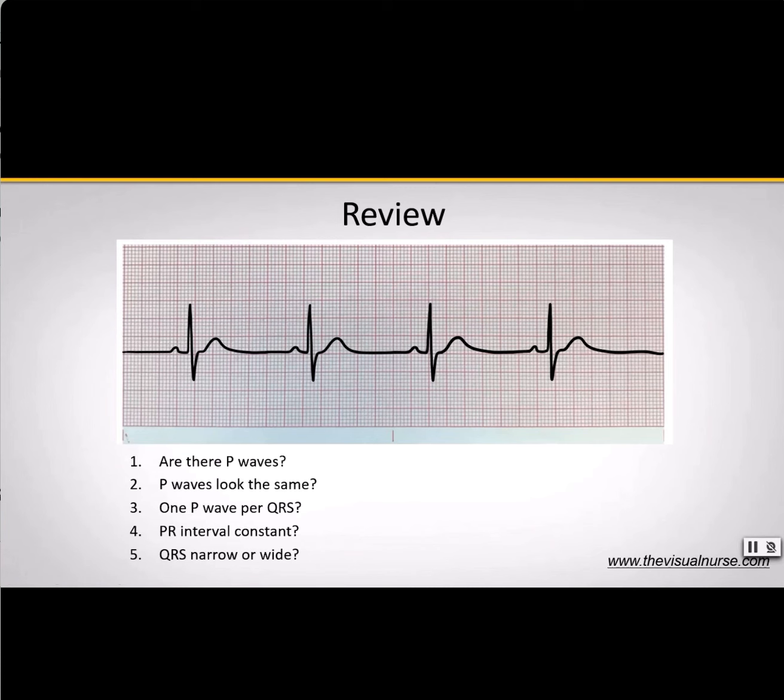The QT interval is spanning from this solid line to about this solid line, or maybe one small box afterwards. So it appears a little bit longer than it should be, but it's roughly half of the R to R interval, so we're okay there. What about the ST segments?